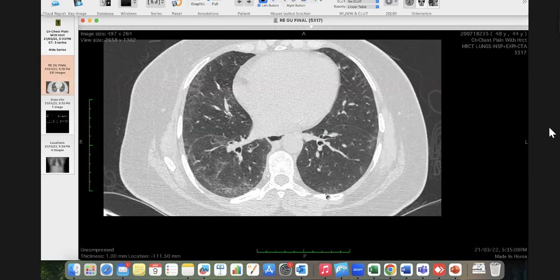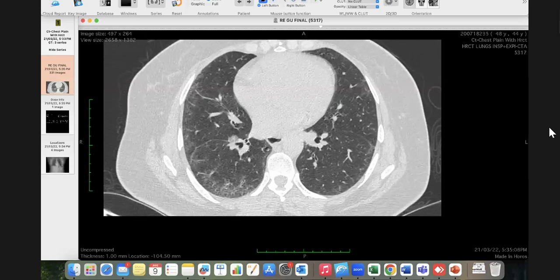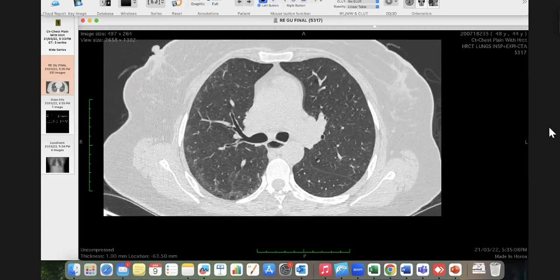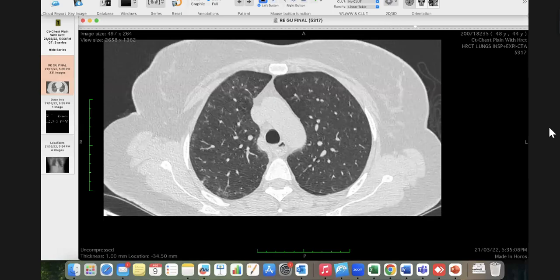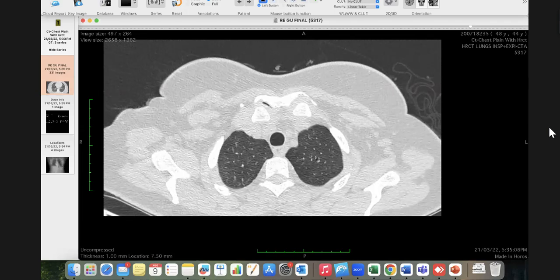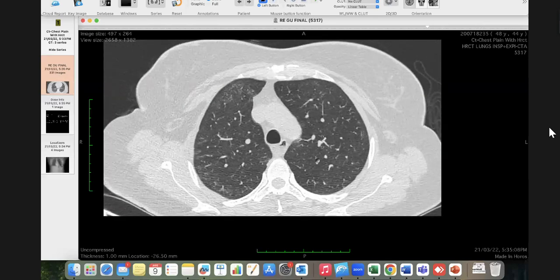And a careful radiologist would note while scrolling down that there is, in addition, a dilated esophagus, which is a sign of scleroderma, and therefore we know there is an underlying connective tissue disease, and NSIP is common in connective tissue disease, particularly in the young. So all this is as good as a biopsy diagnosis. I would call up my pulmonologist and tell them this is NSIP. You don't really need to do a biopsy. It is that classic a finding.